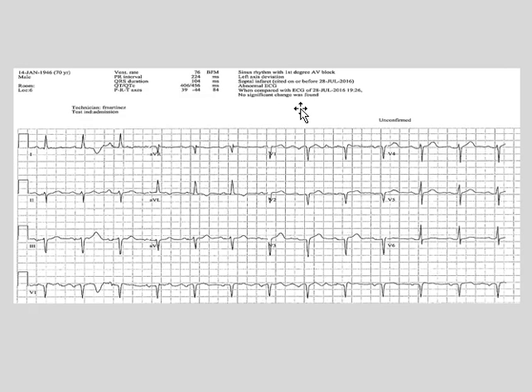So let's look at the writing here. Pretty well agrees with what we said, sinus rhythm. I missed that first degree AV block. Yes, I meant to go back to it. My calipers would have picked it up. And this was fortunate that they had a previous ECG to compare it with, and there was no significant difference. So immediately there is no action taken, other than to recognize his pre-existing history, which is also important.